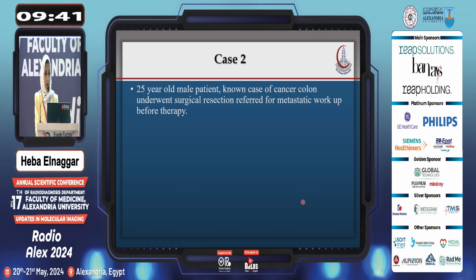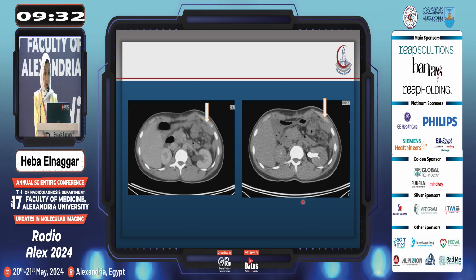We proceed to case number 2, a 25-year-old male patient, known case of cancer colon as well, underwent surgical resection and referred for metastatic workup.